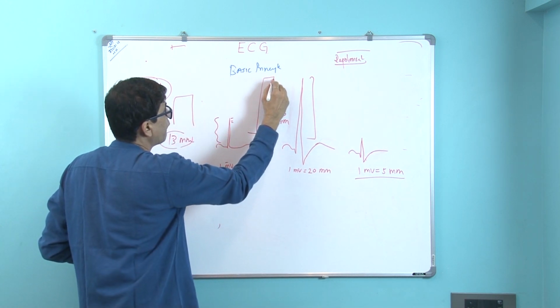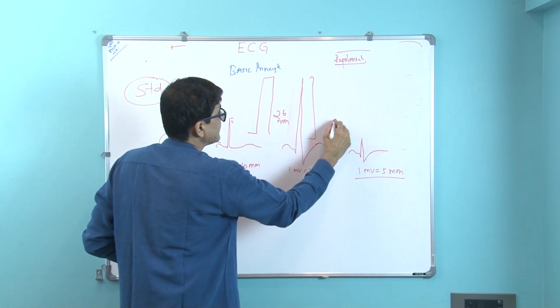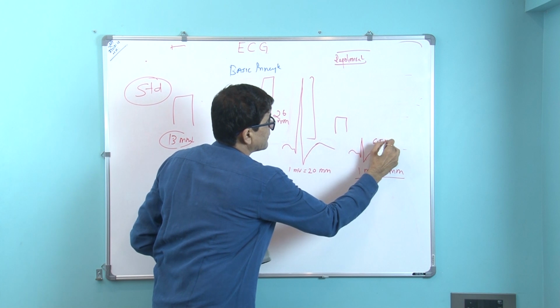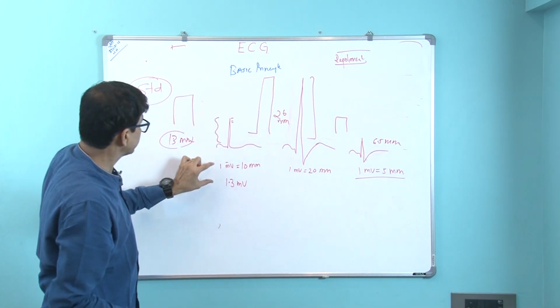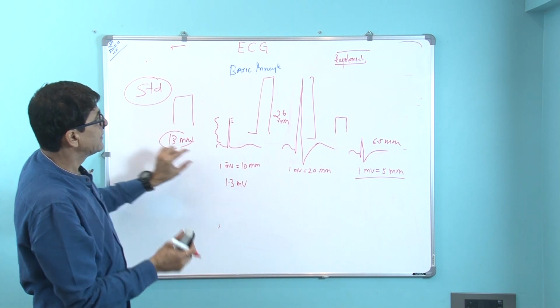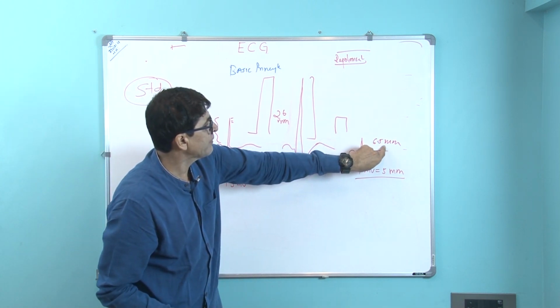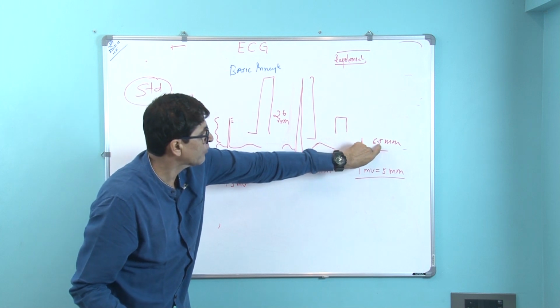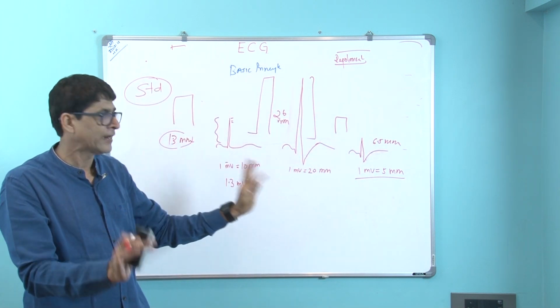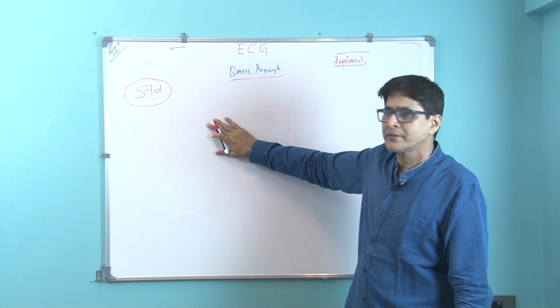This is the standardization default, this is double and this is half. So it will record 6.5 millimeter. The electrical potential difference generated is 1.3 millivolt, but the recorded deflection is 6.5 millimeter. But while calculating, I have to double this. That's all. Understood? We saw standardization.